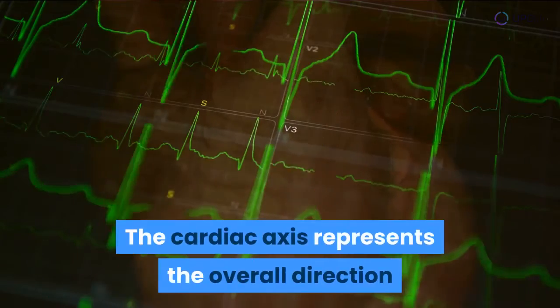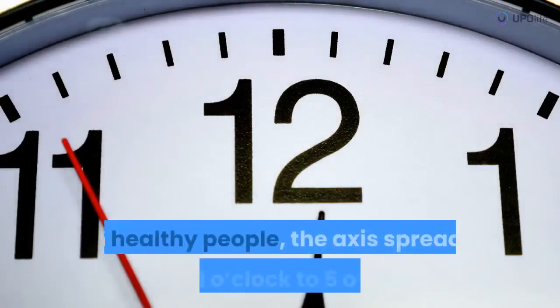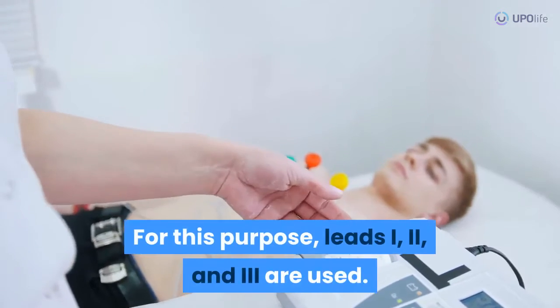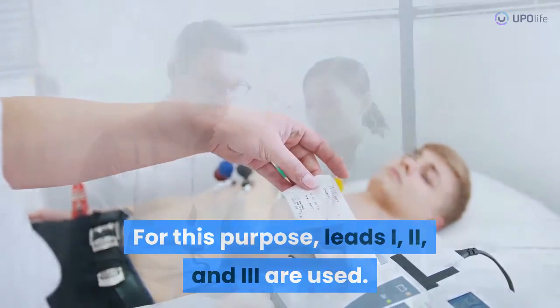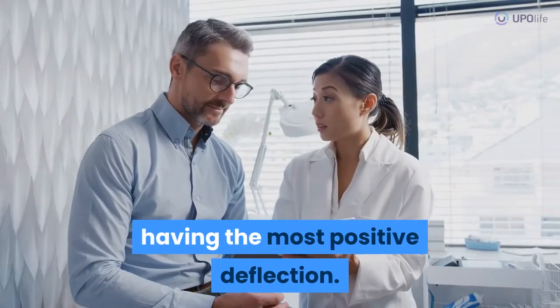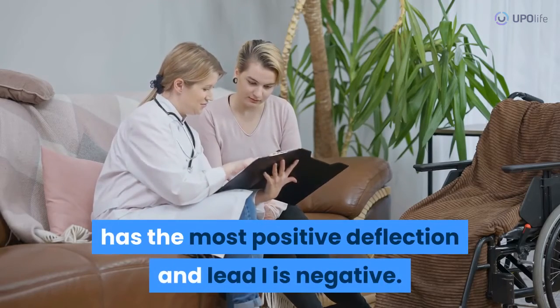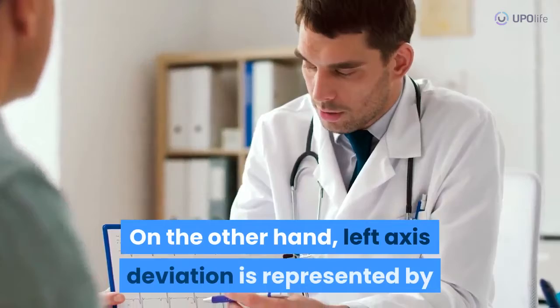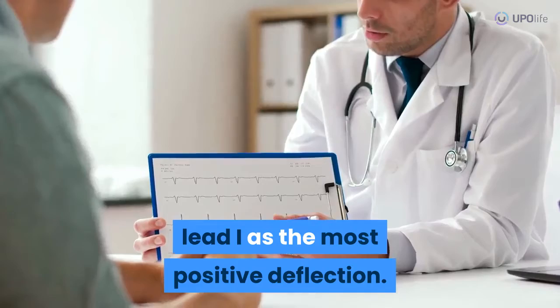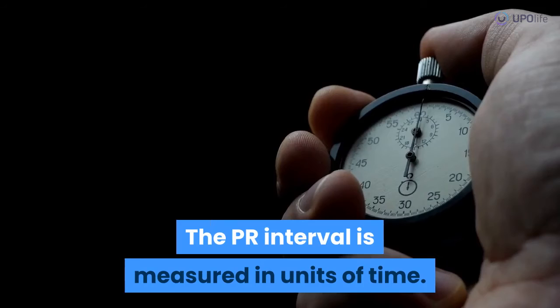The cardiac axis represents the overall direction of the electrical spread within a person's heart. In healthy people, the axis spreads from 11 o'clock to 5 o'clock. For this purpose, leads I, II, and III are used. The normal cardiac axis is indicated by lead II having the most positive deflection. Right axis deviation occurs when lead III has the most positive deflection and lead I is negative. On the other hand, left axis deviation is represented by lead I as the most positive deflection, while leads II and III are negative.